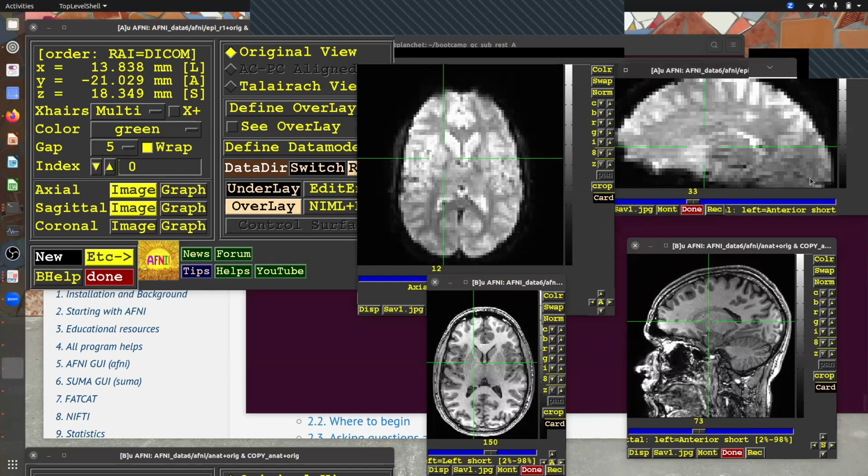Overall, you can also see that we've chopped off part of the brain here as well, whereas I see basically the whole head, even outside the skull. We don't see the skull here, but we can see that the top part of the brain, the person, much like myself, has had a close haircut recently. Unlike me, they've also had their cerebellum chopped off. So we've traded off a lot of things when we acquire this data.